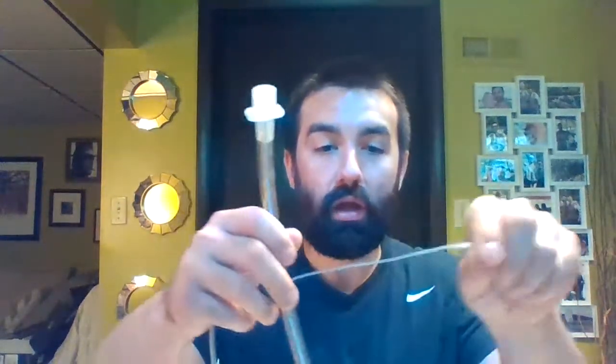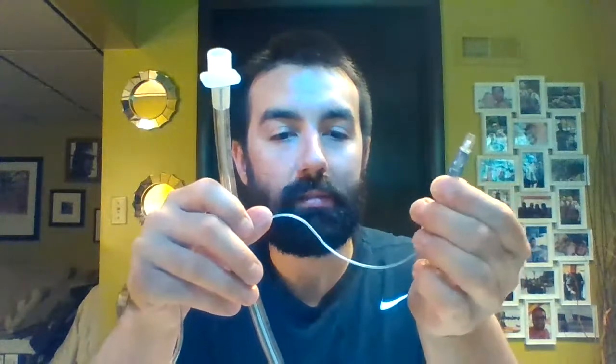Sometimes we end up having to take that C-collar off and do manual stabilization and a bunch of other stuff that you kind of get used to. Couple other things here. So we got our pilot balloon, and it's essential. I'm going to go over these different things because I'm going to do an airway troubleshooting video here in a bit.